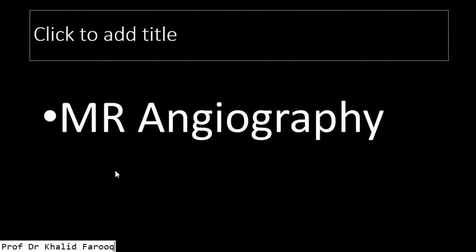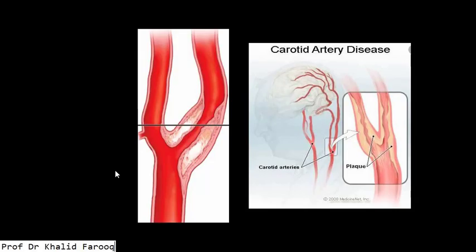Now for the treatment purpose, this is schematic diagram. We can see atheromatous changes in proximal portion of internal carotid artery, and here in this case, whenever luminal narrowing is more than 70%, treatment is surgical in the shape of endarterectomy.